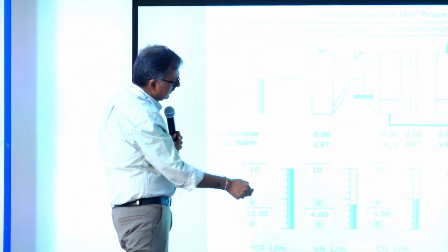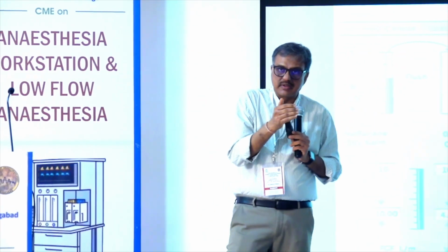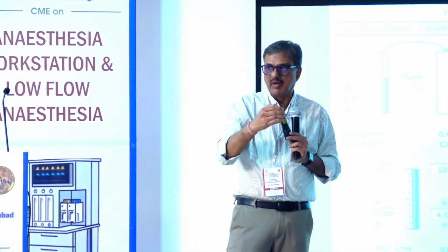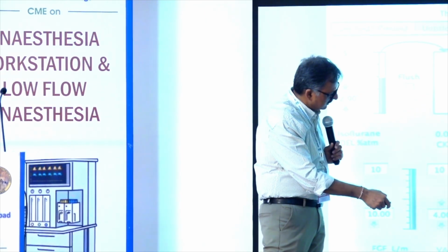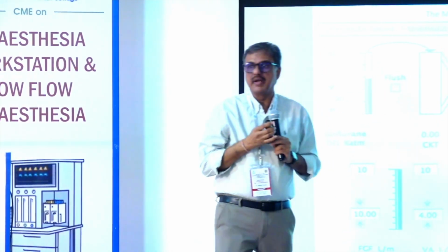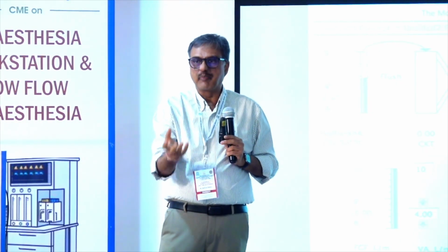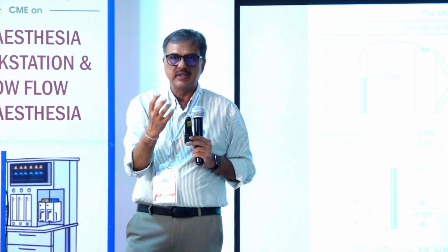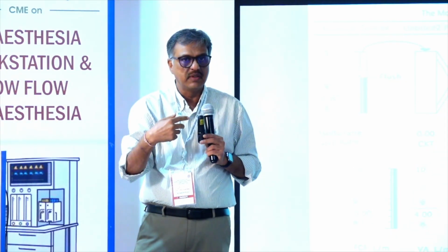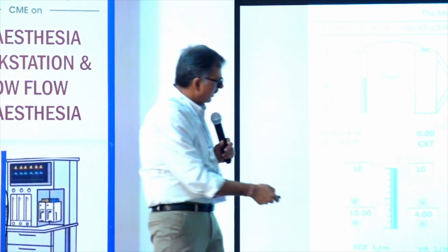This part is clear to you? This is very important. What are you looking at here? Time. That shows the duration of anesthesia: 1 hour, 2 hour, 3 hour, 4 hour. What is this? Uptake in the form of volume, vapor. Fine. So it shows the uptake, meaning the agent or gas taken up by the patient in the form of vapor in liters. Okay. And this one is delivered.